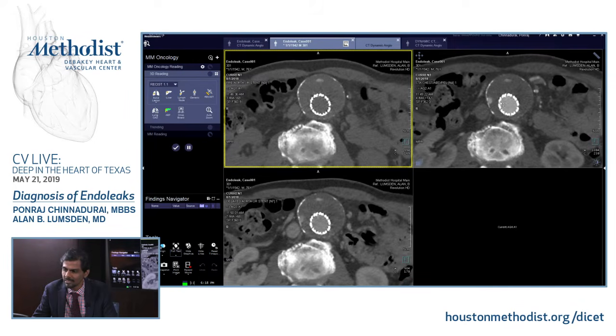This is the arterial phase. You can see the contrast in the aorta, and this is a delayed phase where it is a little fainter. I can't tell you exactly, but I can tell you this is 11:49 and 11:50, so this was roughly a 1 minute later scan.